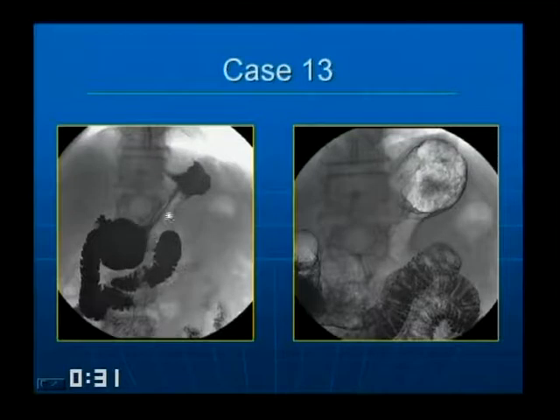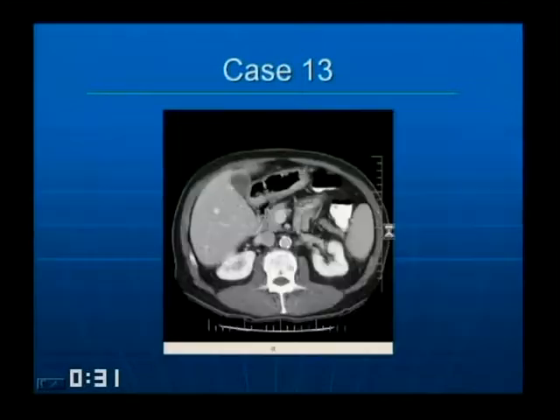So an ab lesion involving the stomach, circumferential involvement. This is adenocarcinoma of the stomach, very infiltrative, aggressive carcinoma. And here you see on the stomach on CT scan, I did not show you this image, a circumferential wall thickening involving the stomach.